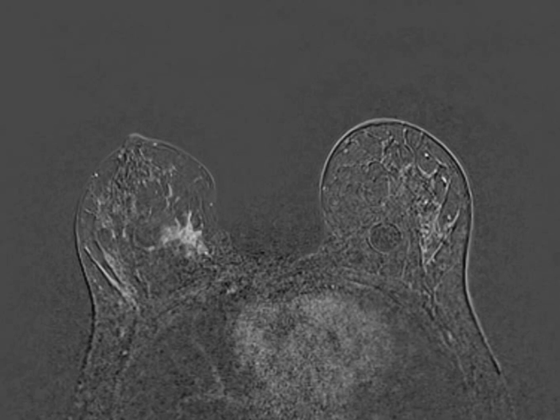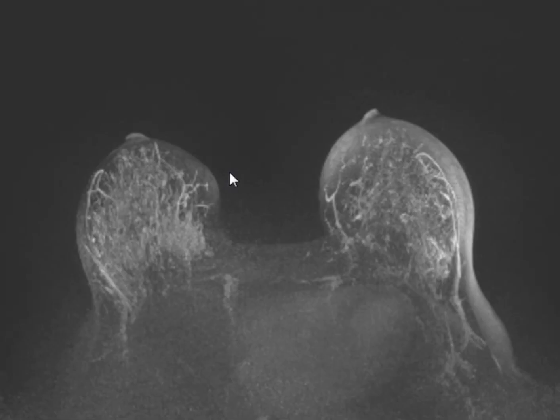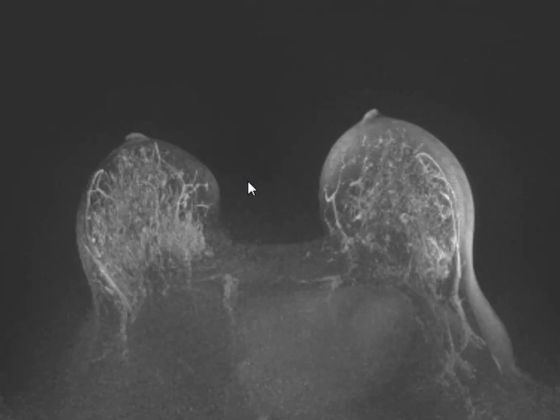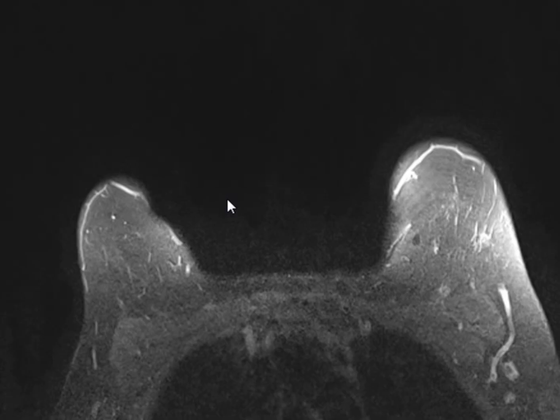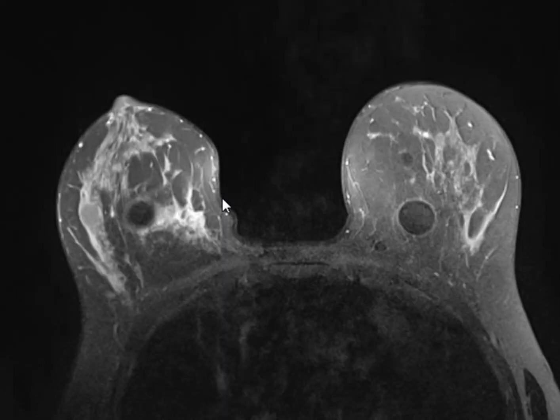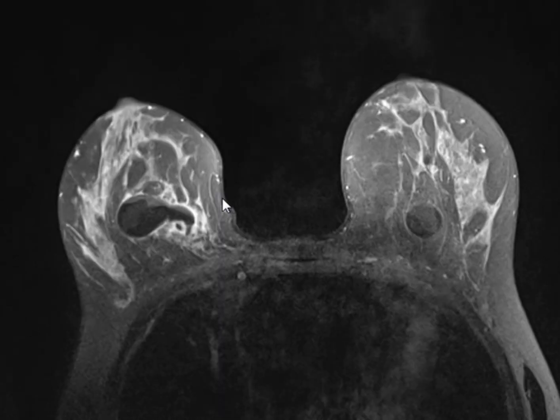At the end here, we do something like a compound view. All the post contrast images compound into one image. Okay, you see just diffuse parenchymal enhancement. It's nothing specific, let's say. Okay, what else? This is T1 post contrast, normal, not dynamic image. Normal T1 post contrast, fat saturated, of course.